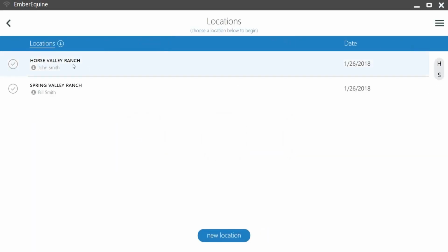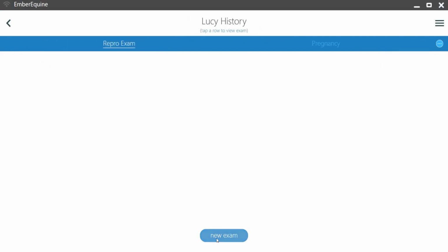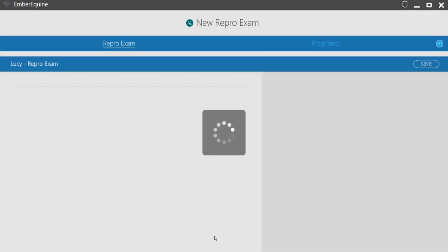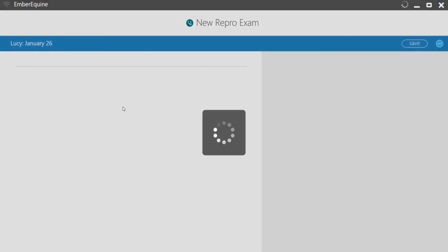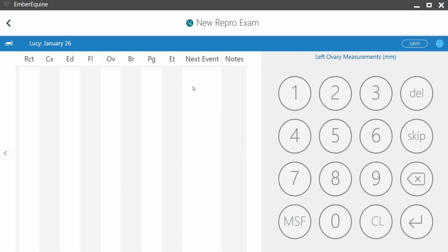So under Start, go to Horse Valley Ranch, select Lucy, and you can begin a new examination. In this segment, you can enter in left ovary, right ovary, left cyst, right cyst, cervix, edema, fluid, ovulation, bred, pregnant, next event, and notes.